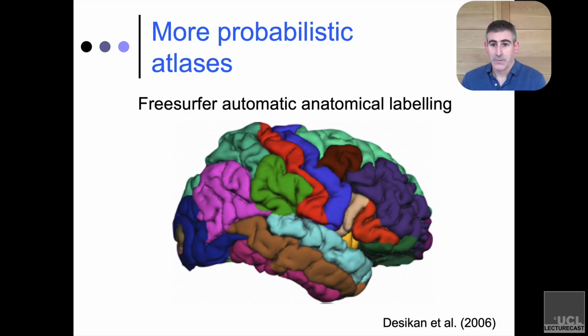That's superb, right? Because this is a great way to start to learn some of the anatomy. And the other thing is it's unbiased, right? It's using the same criteria across every brain, every hemisphere. So there's no temptation for you to hedge and say, I was hoping the activation was in the parahippocampus rather than the fusiform. And maybe, because there's this extra sulcus here, that is parahippocampus, you know, which happens. It's inevitable. It happens to all of us. One of the nice things about using this algorithm that Desikan and colleagues developed in FreeSurfer is that you can avoid that kind of bias.